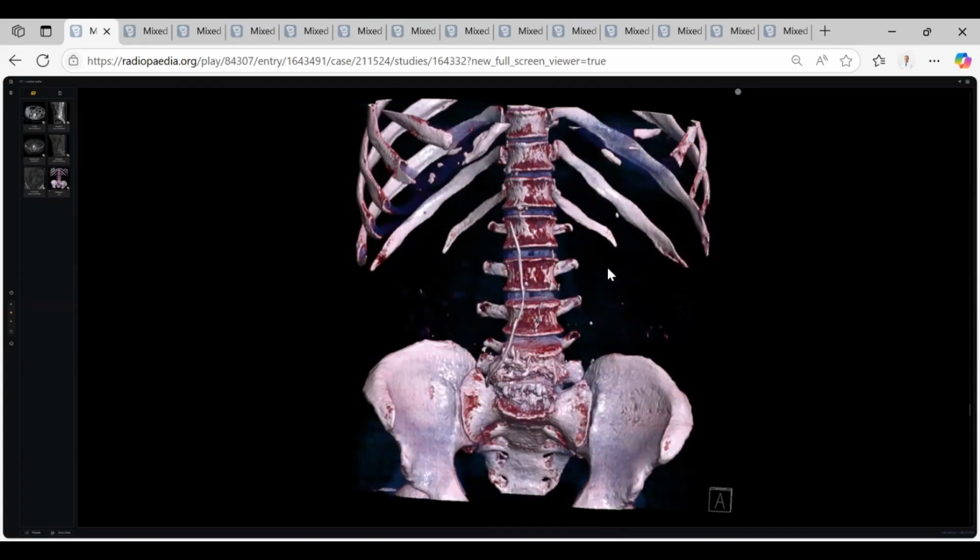By the way, my colleagues, this is a case of cement embolism within the pulmonary arteries and a missed or retained IVC stent. In Radiopaedia, they diagnose the IVC finding also as cement, but I think no, this is a catheter. I think also Dr. Sami Khan showed this case before and he commented on this as a catheter. Thank you, doctor, so much. Did very well.